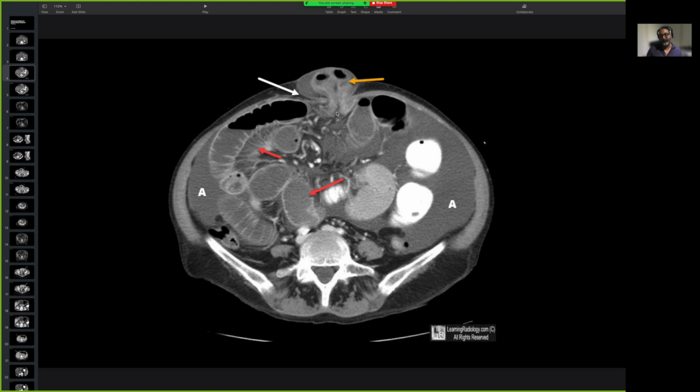Now, this is the same hernia from the anterior wall, but you see more here. You see dilated, fluid-filled loops in the ileum, and you also see ascites and fluid filling the peritoneal cavity. So this is a hernia that has strangulated and caused a bowel obstruction. Hernias can cause bowel obstructions. So if you have a question, just come in and shoot.